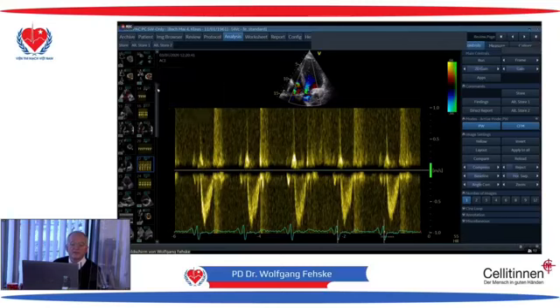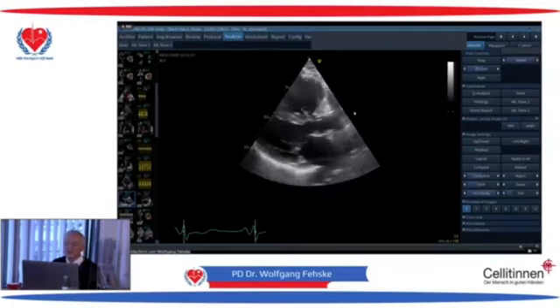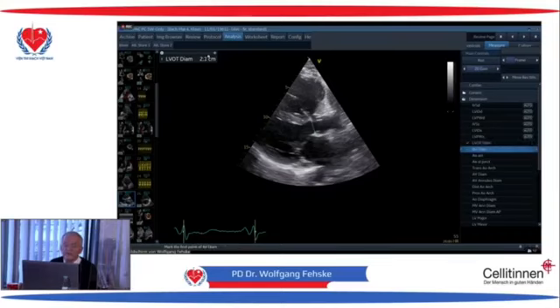So it is extremely important to know what is the net effective stroke volume of the heart, and for that we need to have an idea of the cardiac output. The left ventricular, I told you, this is a crucial point where we take it, but we take a systolic image. We take this as the diameter, and we call it left ventricular outflow tract.